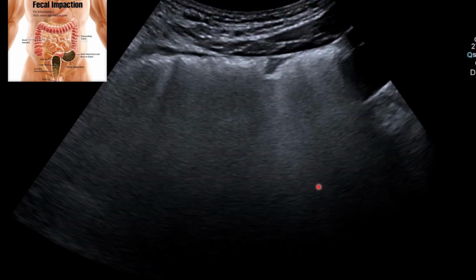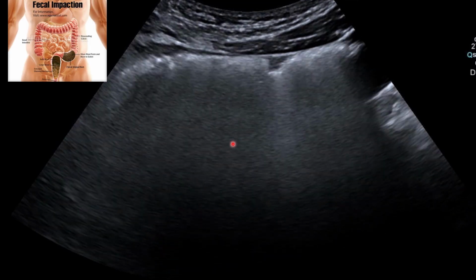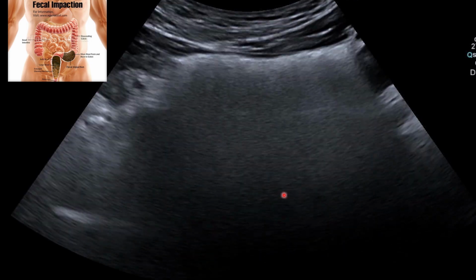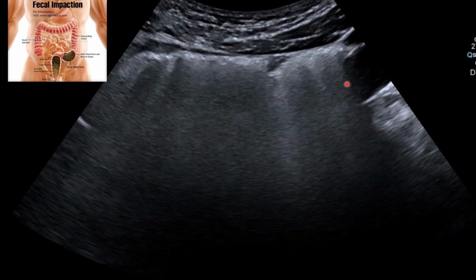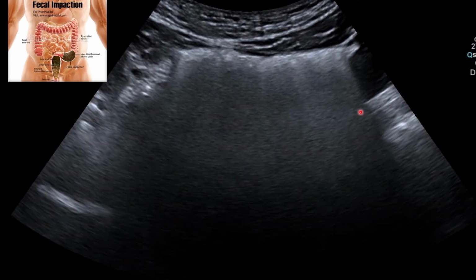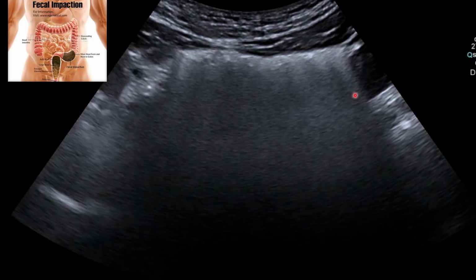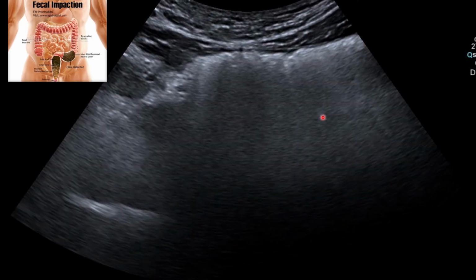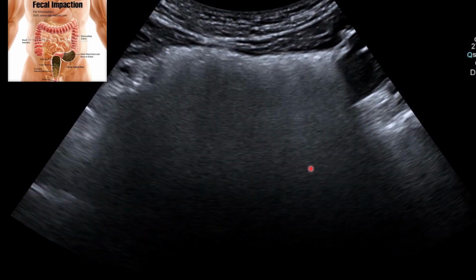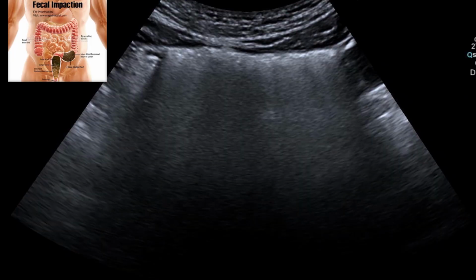A number of you, when I uploaded a video where I was explaining bowel obstruction, were asking how do we differentiate bowel obstruction from fecal loading. So I think the message is very clear, and the differences are very clear as well.